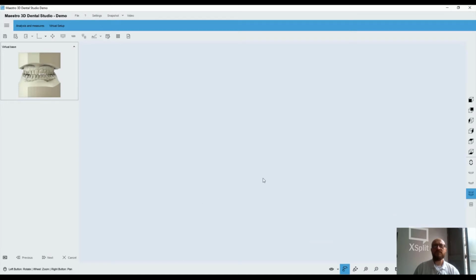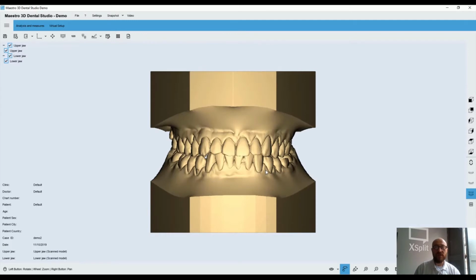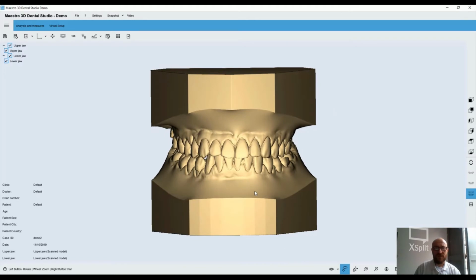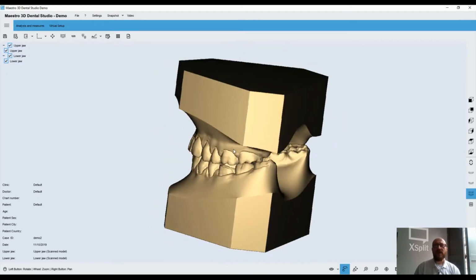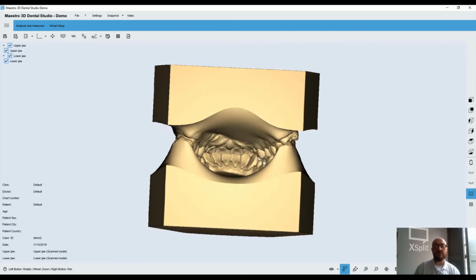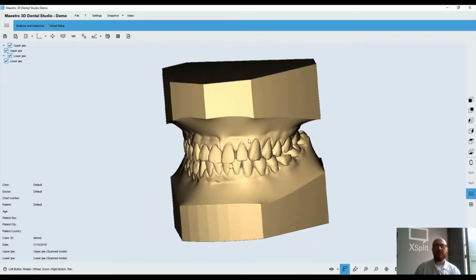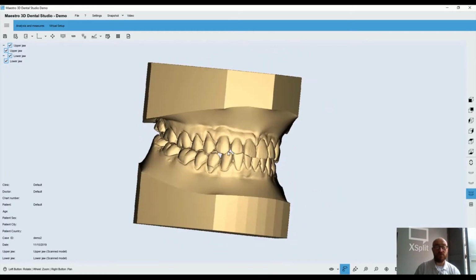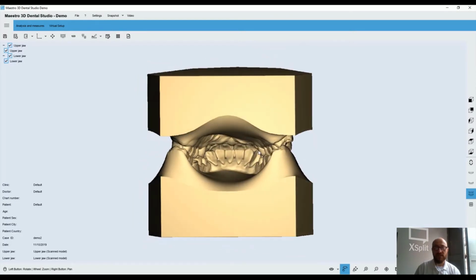I would like to point out that I'm not designing this project from, let's say, a medical point of view, but just for showing you what is possible to do with this software. So I'm not a doctor, I'm not a dentist, but I just would like to show you how to do and what is possible to do. Then it's up to you to apply your theories, to apply your processes and so on in order to obtain the perfect result from the medical point of view.